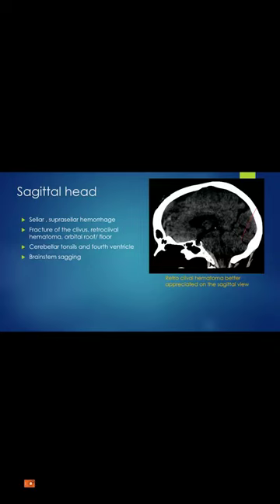All these can be seen with just a couple of sagittal runs, maybe three or four cuts will solve it. So while you're doing your search pattern, just consider these potential findings and in which direction they are easy to see.